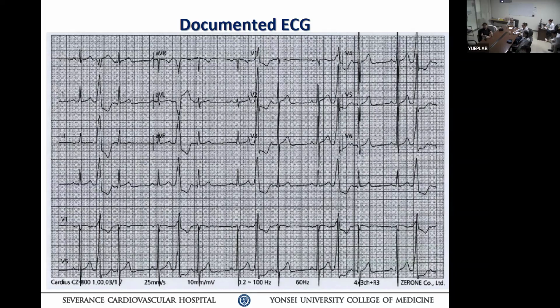So we need to do this systematically because you're really going to do it like that in your practice. You're not just going to say, oh, this is a PVC. No, that's not even half complete. So we really want to know whether this baseline sinus rhythm QRS complex has to do with this PVC. That's another thing we can know, right? Tell me whether the QRS complex of the PVC is the same or varies. First question. What do you think?